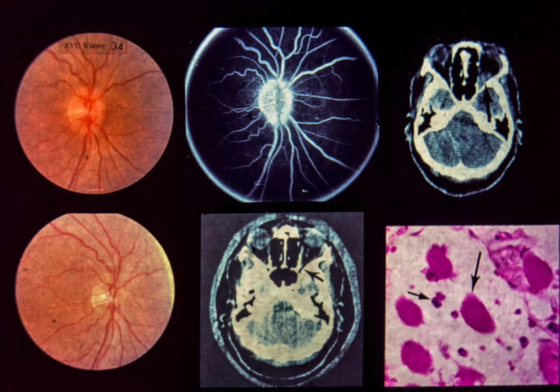The patient was given thyroid replacement, and within 3 days noted visual improvement in the right eye. Lower left. 4 days after thyroid replacement was started, the right optic disc is no longer hyperemic and the edema has subsided. Visual acuity is 20/25. Lower center.